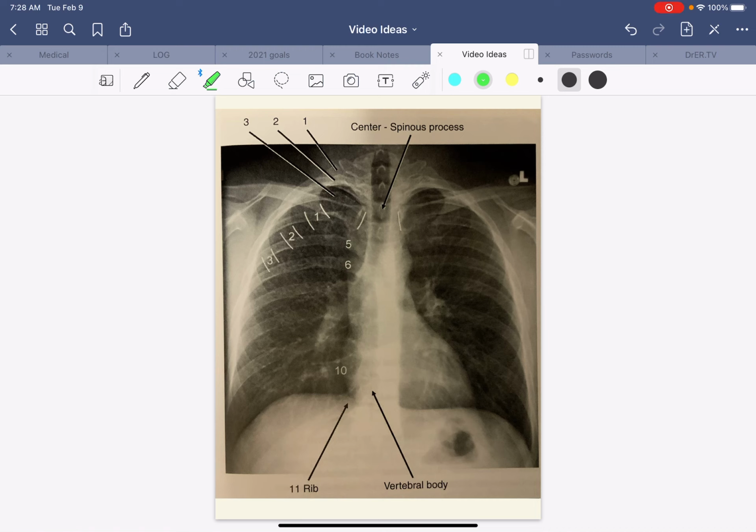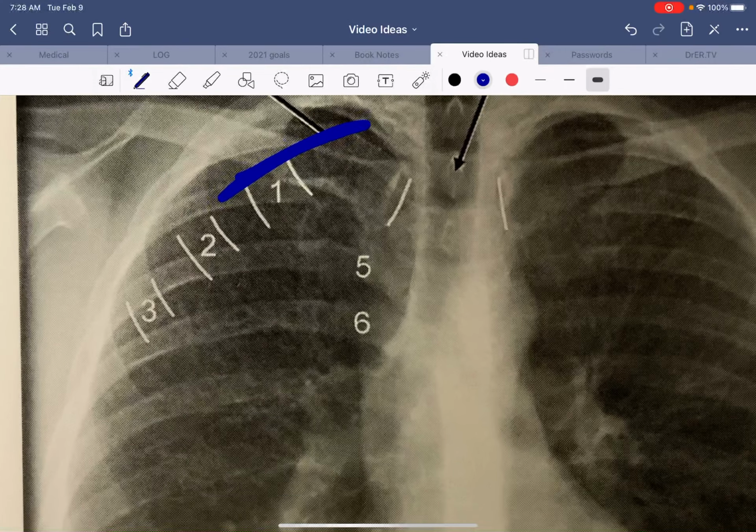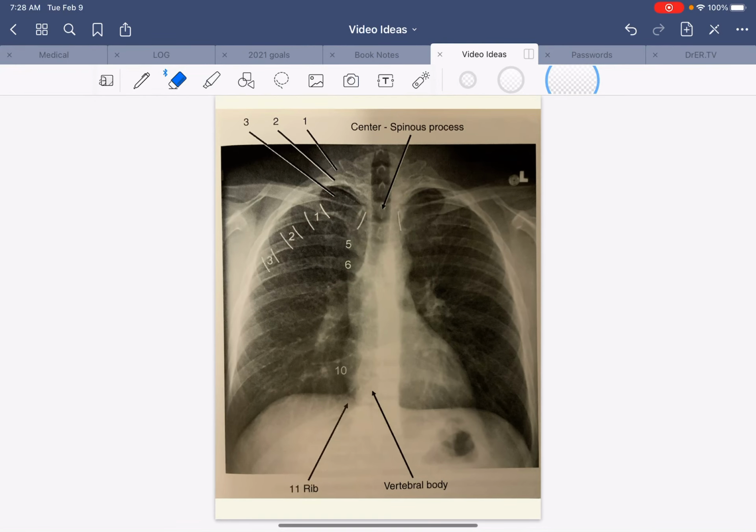And then finally, diagnosis. You should definitely be looking at every x-ray and really zooming in, especially over here, to make sure you don't miss a pneumothorax, which would be a very faint line there. I mean, a large pneumothorax would be like that, but sometimes they're tiny and they're up here. So you gotta make sure you look at those very well in very good detail. And that's it. So initial overall review, systematic approach, and lastly, a targeted approach to chest radiograph interpretation.